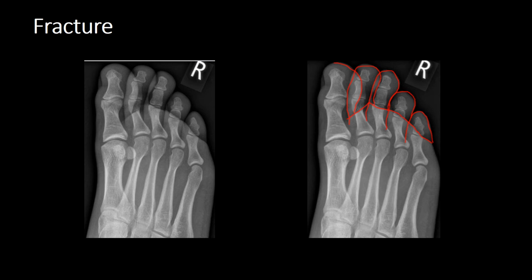I think this is a great X-ray at showing how challenging foot X-rays can be. There's an awful lot of overlapping structures. In particular in this patient, there's a lot of overlapping soft tissue. And these soft tissue overlaps can quite easily create some confusion, because when you have 2 overlapping structures of different densities, you get an optical illusion where they meet in the appearance of an apparent lucent line. This is called a Mach effect.